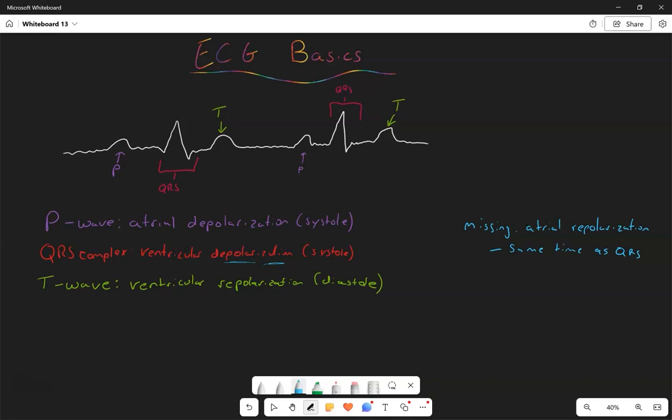Okay, now the first thing that we can do for looking at the ECG and calculating some metrics is looking at what we refer to as the RR interval. Let me get a different color here. Okay, so we're going to look at the RR interval. Okay, and the RR interval is the timing for one cardiac cycle. So we use RR interval because it's the easiest peaks to see. So here, all the way over to here, right? That's our RR interval. All right, and so we can use that to determine how long it takes for the heart to go through a cardiac cycle. And so we can count the number of cardiac cycles per minute, or make an estimate of the number of cardiac cycles per minute. And we can calculate heart rate that way.